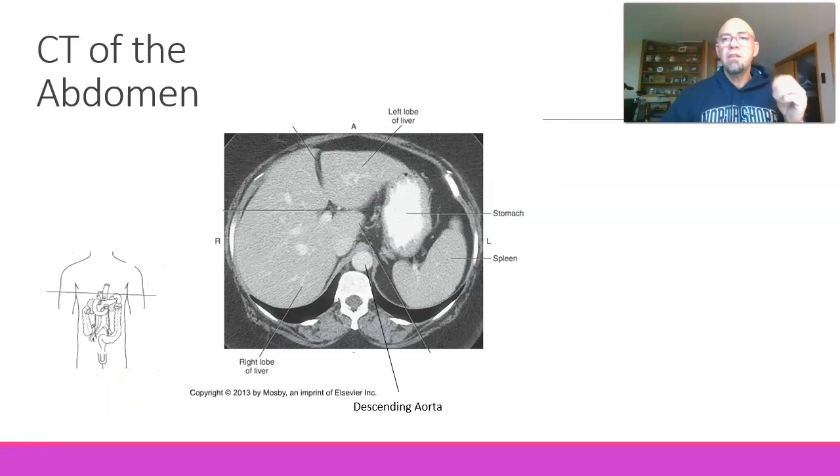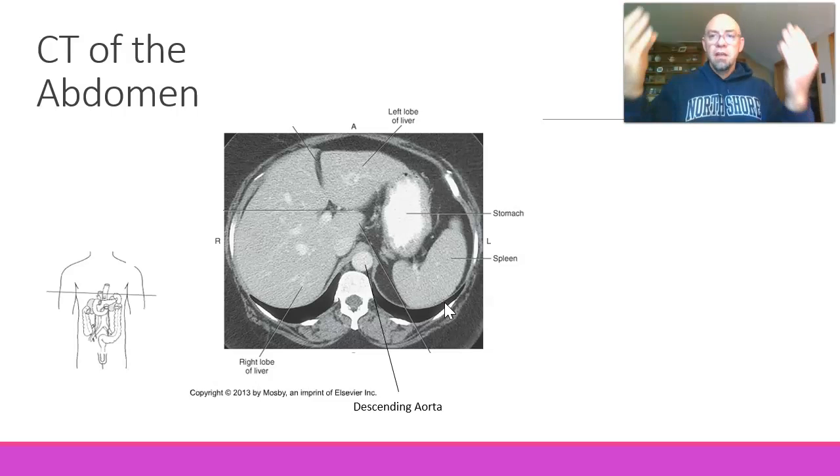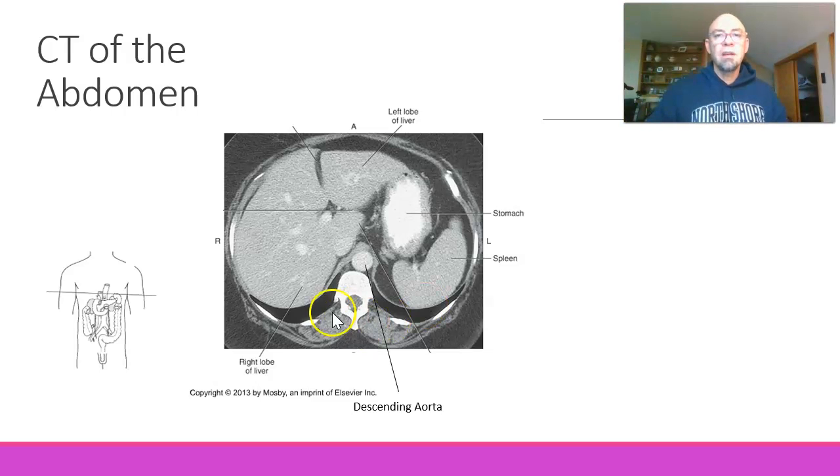All right, we've made our way to the abdomen. So we've gone below the lung field, and now we are looking at parts of the abdomen, and obviously the big organ on the right side is going to be the liver. You can see how big it is. It is really big. This blackness here, that is air. So that is actually the costophrenic angle, the very bottom. When you do a lateral view of a person's chest, you can see those costophrenic angles really work their way down in the posterior aspects of it, and that's what this is.